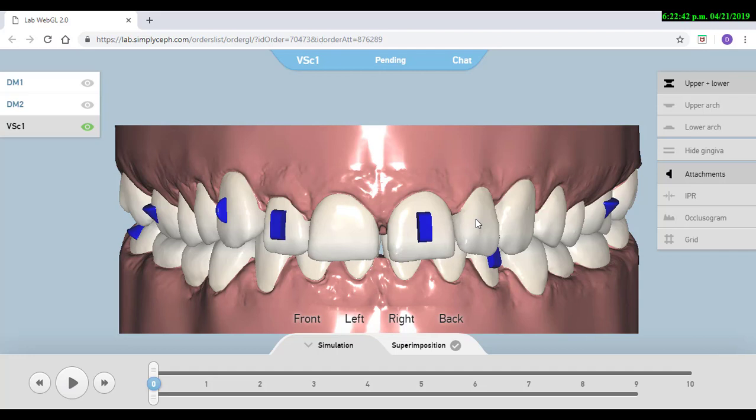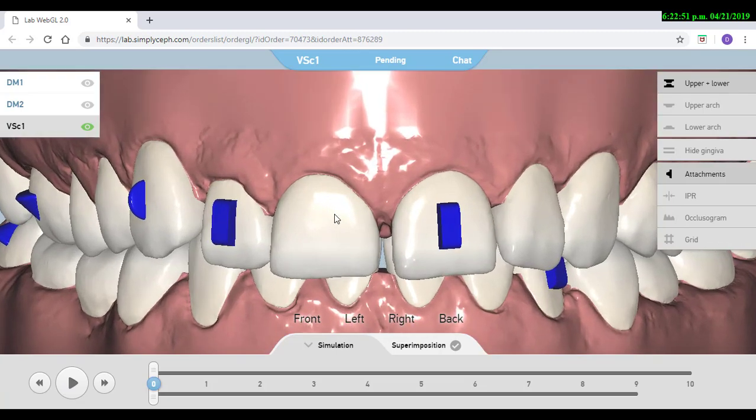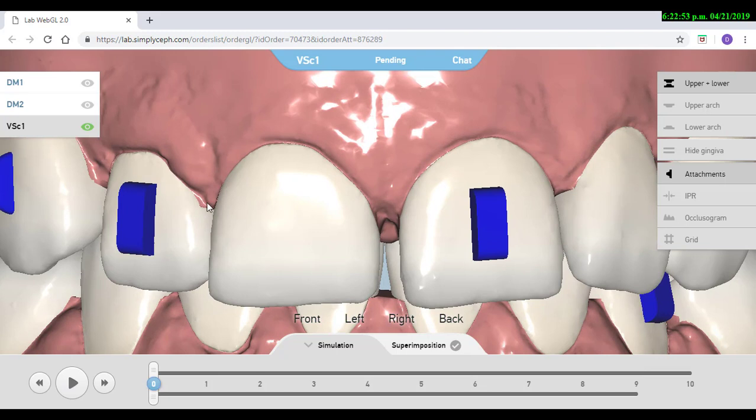An additional step that we are going to use is only when we see big gingival recessions in our patients. So it is important that when you see this gingiva in this position, that is going to be printed in the model where the aligners are going to be fabricated on.